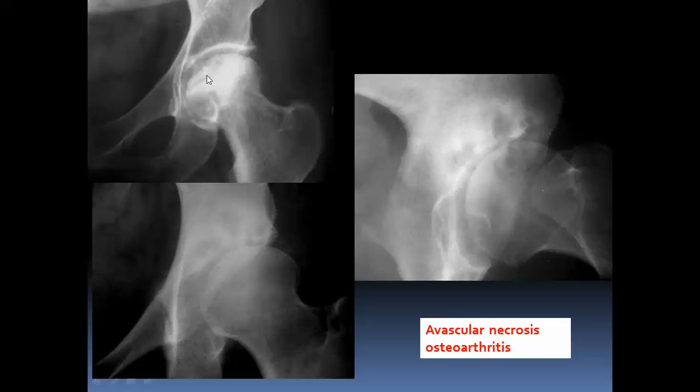And we said that in avascular necrosis, we can see heterogeneity, and then we can see an attempt at separation, and then complete cleavage, and then separation of the fragment. While in Perthes disease, the process involves the whole epiphysis. There is an epiphyseal plate, so the whole epiphysis is involved in heterogeneity, fragmentation, condensation, and the healing is the collapsed head.